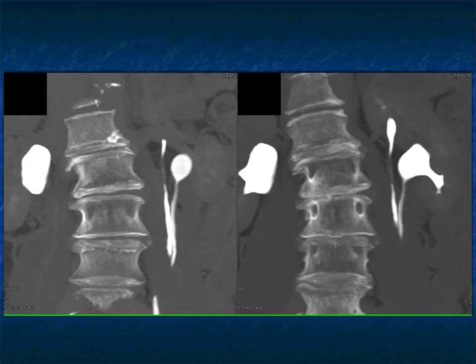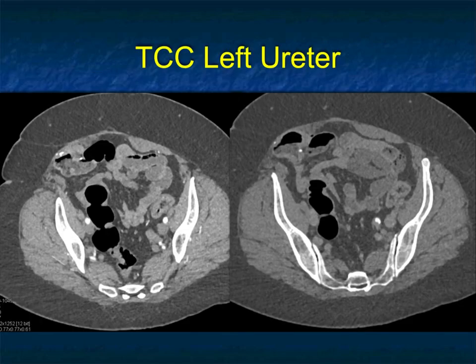But here very nicely with the ureter and the calyces all opacified, you can see the 2 centimeter long tumor in this segment of a patient with a duplicated collecting system, but in the upper pole, there's the patient's tumor.